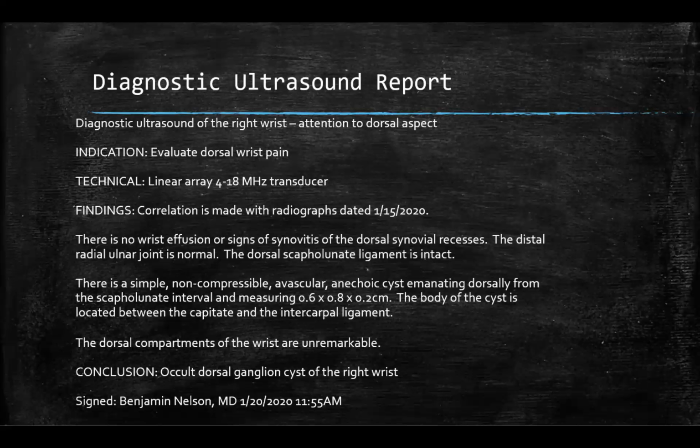And so working through those, again, just systematically and using the information that you can get and describing it as well as you can will help give you most of those clues. And then putting the pieces together with the images you have. So looking at the borders, the matrix, the vascularity, the compressibility, using all of those studies will help you differentiate.